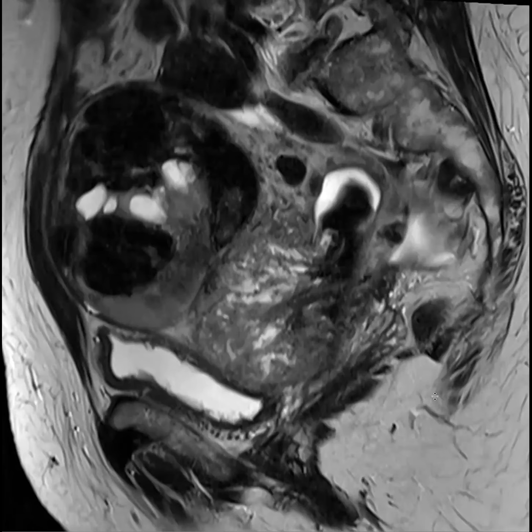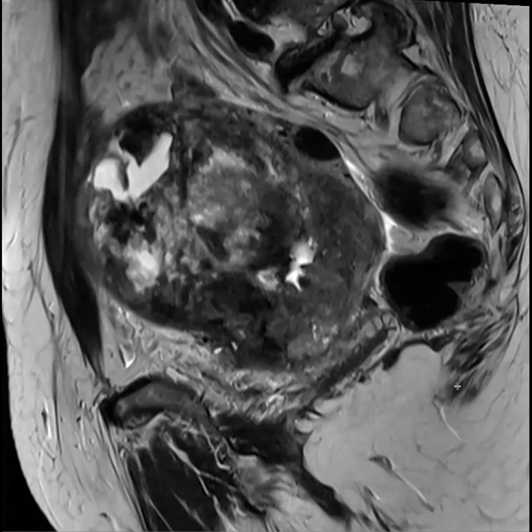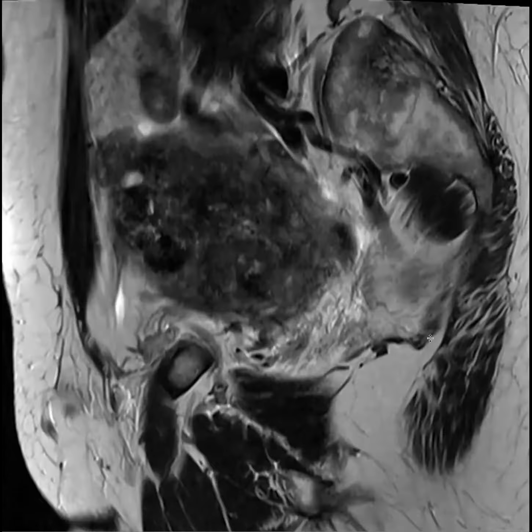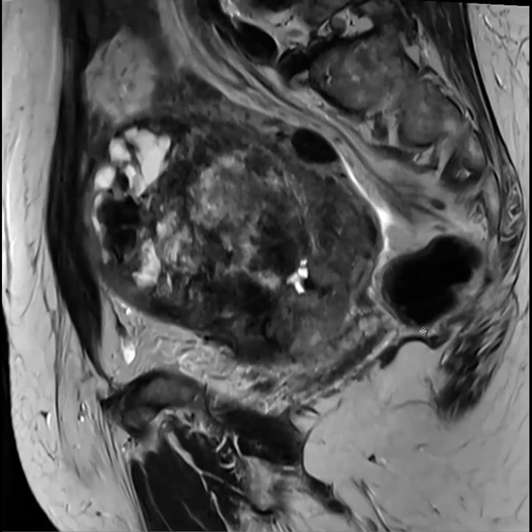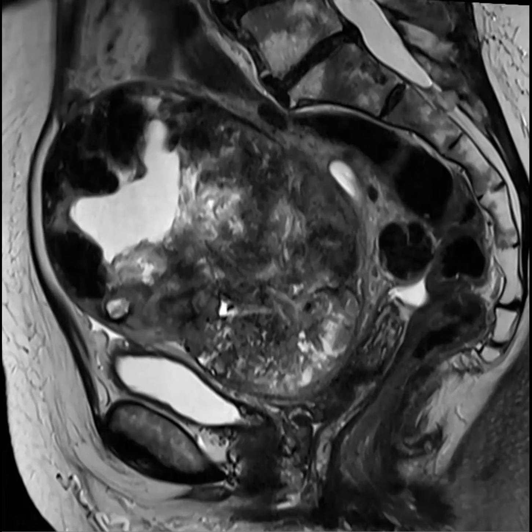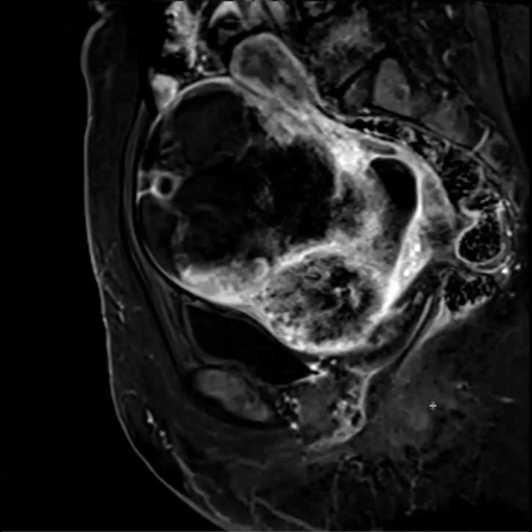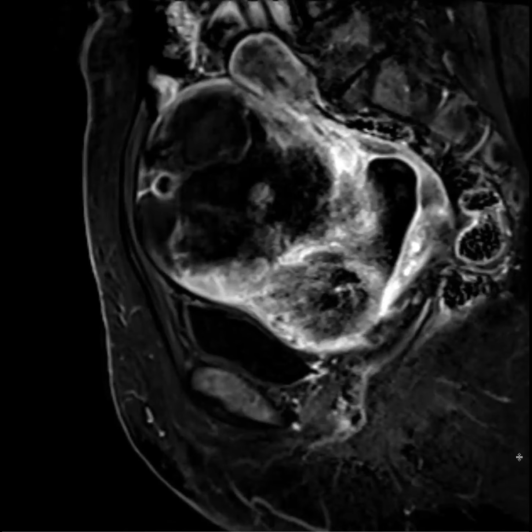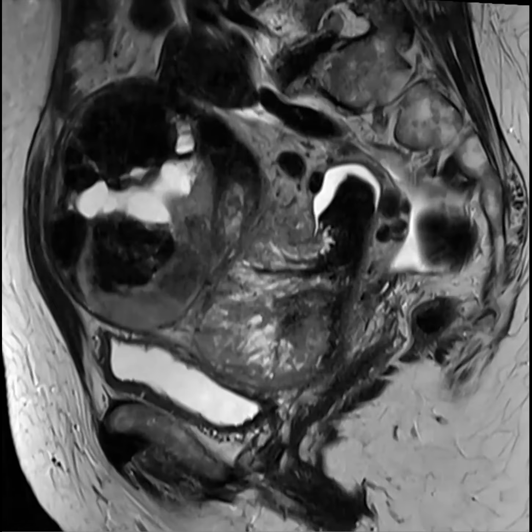Patient with uterine mass. So this is a companion case, and this is a little bit more abnormal looking, ugly. So the contrast enhancement, here's this retraction. There are areas of necrosis centrally, a peripheral enhancing area, and there's probably an endometrial extension or involvement. Here, there's this kind of extension into the endometrium.